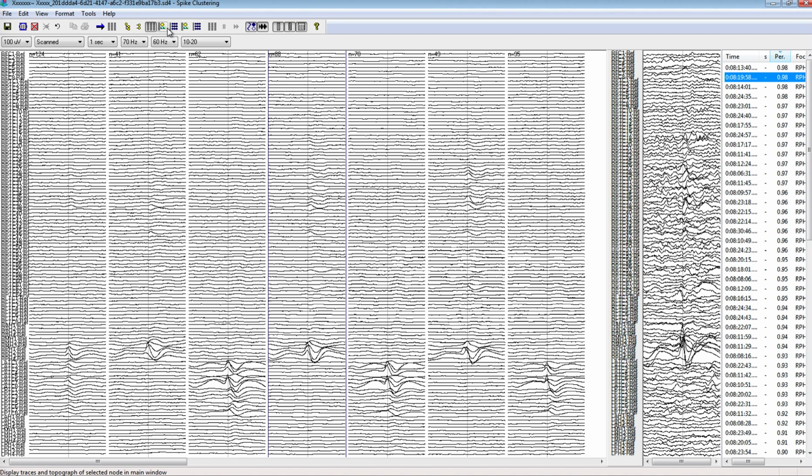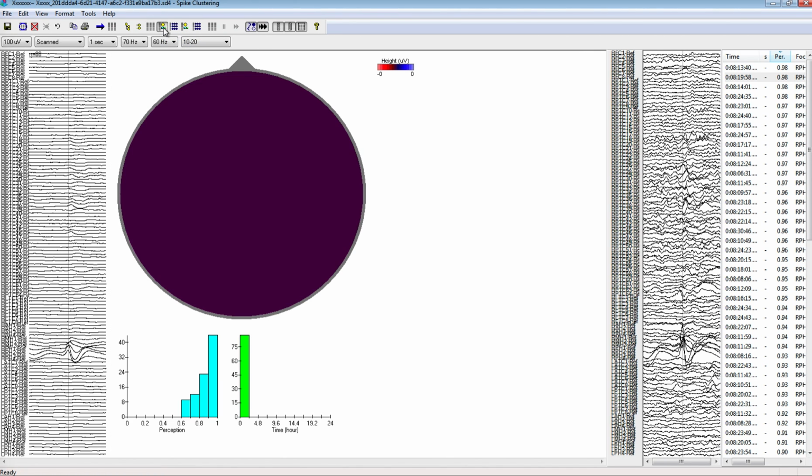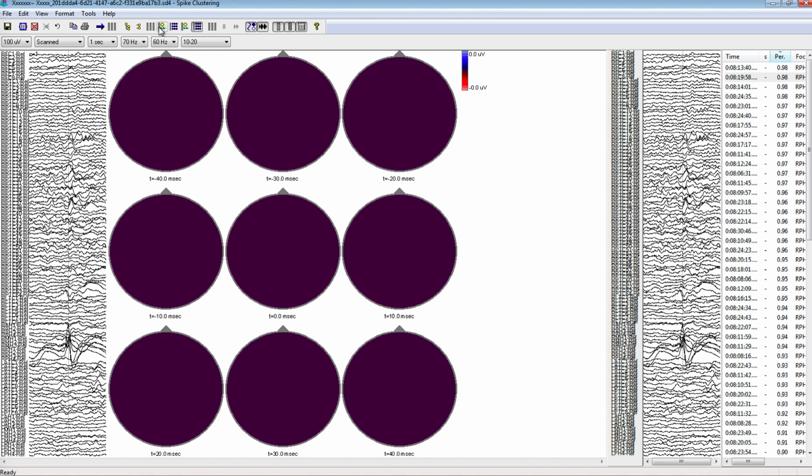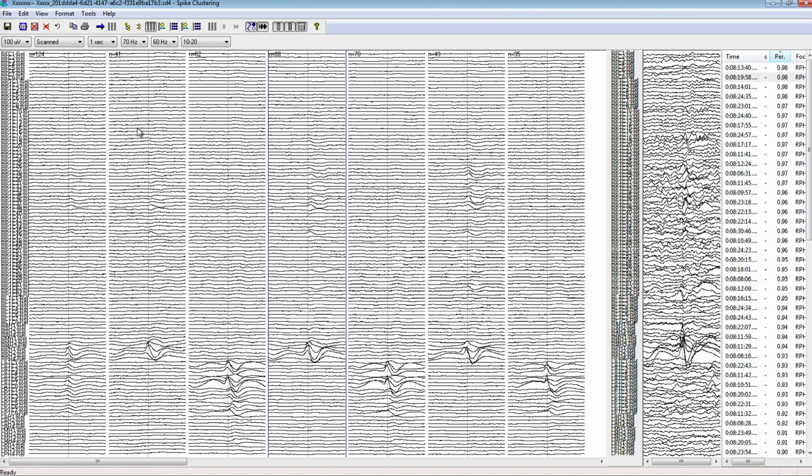We can look at detail of the selected nodes or the selected event. Again, the maps in this case, we could build maps to reflect the layout of electrodes using bitmaps and electrodes, labels, do propagation maps. And again, this is where we want to create the maps in advance to do that. But in this case, we're just going to use the leaf node traces and go through them using the waveforms.